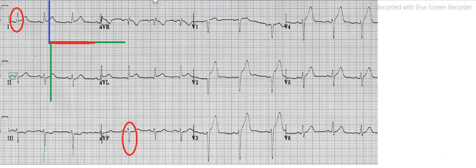So basically here is one imaginary perpendicular line, and here is another, and when we draw the resultant, it forms somehow like here. So it is greater than minus 30 degrees, so it is left axis deviation. So that inference you can put.